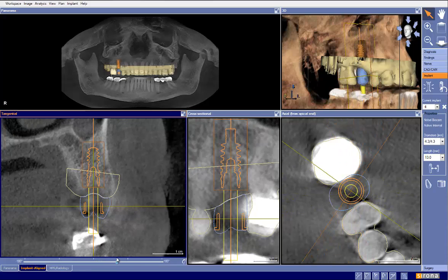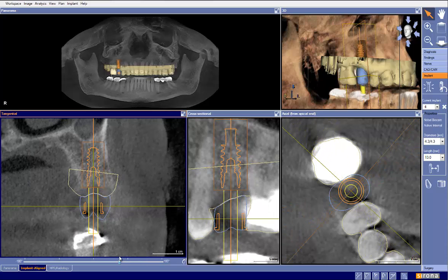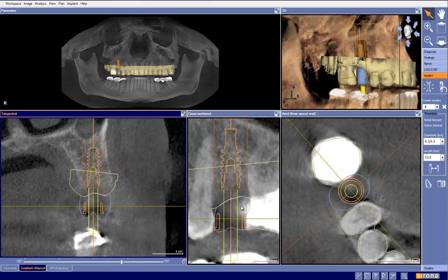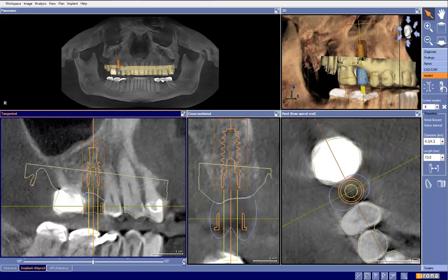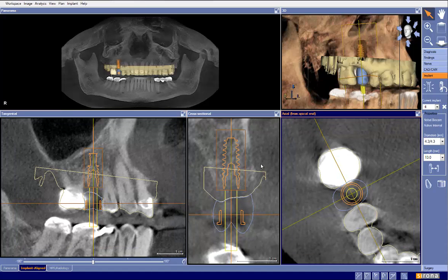And here we can see that there's really not much to worry about. The only thing we really have to pay attention to is the sleeves on the adjacent teeth, any bone defects like that right there, and any type of sleeve hitting the tissue. And so far, we look very good there. So again, I would definitely make a couple of small changes to this plan. The plan as it was sent will certainly work, but this plan, as it's been corrected, is certainly a little bit better. So hopefully that was helpful, and we appreciate you sending in the case.